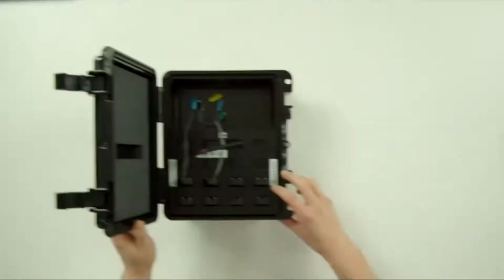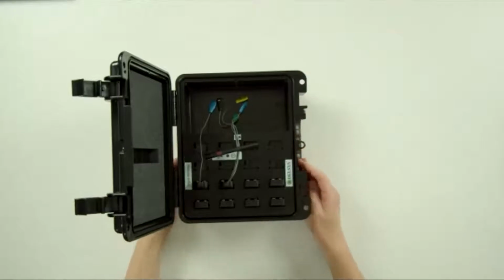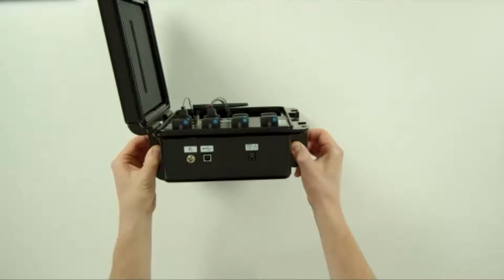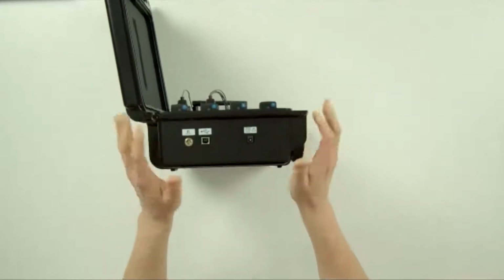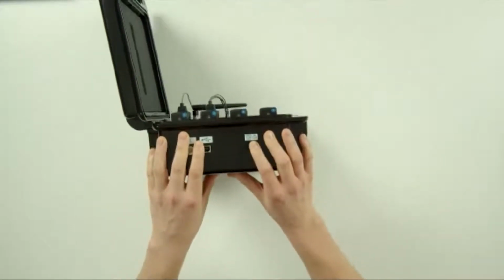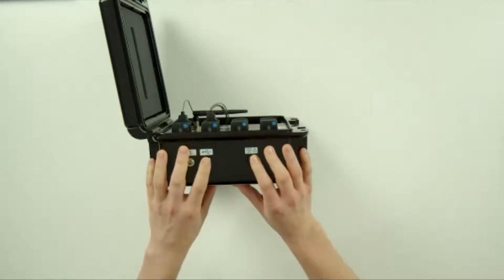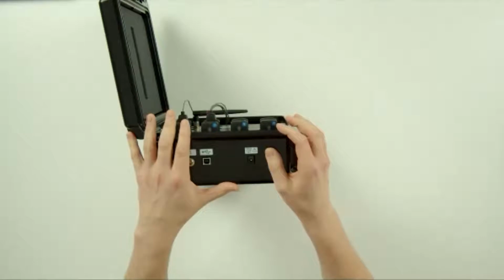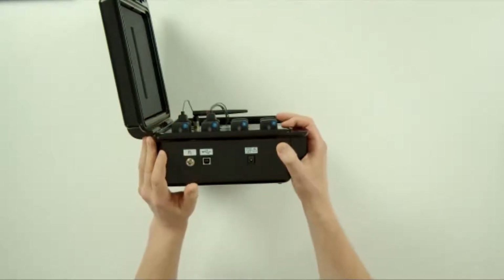Thank you, Niels. So let me show you now on our overhead camera a little bit more about the Delsys products, and particularly the Delsys Trigno system that maybe some of you either have in your labs or have seen around before. The Delsys Trigno system was released back in 2008, and since then, where we had just a single channel of EMG and an accelerometer sensor, we now have evolved this platform to be able to support a whole range of different sensor types, to be able to collect multiple channels of EMG and IMU and other biomechanical and physiological data.